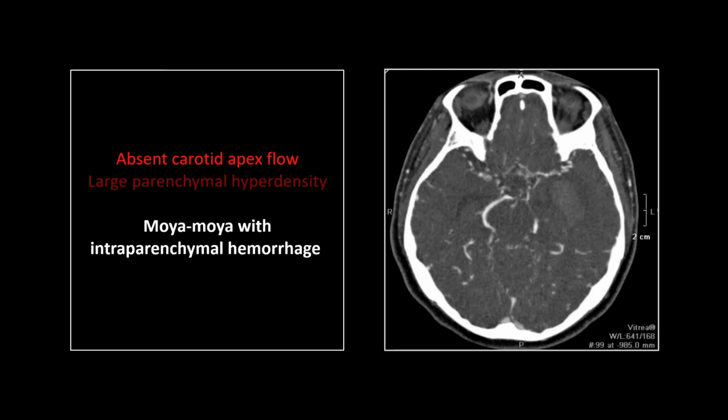All right, this next one is, oh, I broke my rules. Sorry, I did include one contrast study. I knew it was in there. But you can't really show this one without contrast. So this one is a CTA, and this is moyamoya.